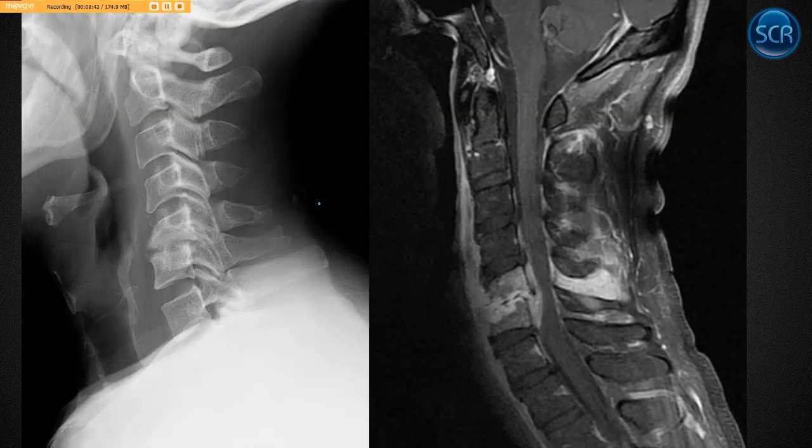Here's a case of someone, we look down here, ADI, fine, posterior ponticle, no one cares. We come down this posterior vertebral body line, everything looks good. When you get down to here, there's a retrolisthesis, actually. And at that same level, there's a retrolisthesis, there's all the sclerosis, and there's destruction of the end plates. So we're thinking something bad.